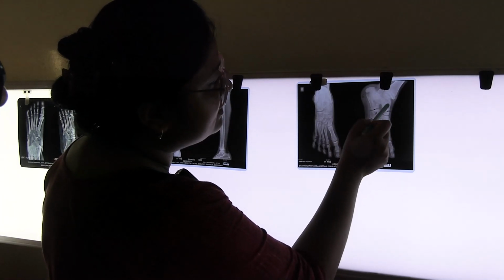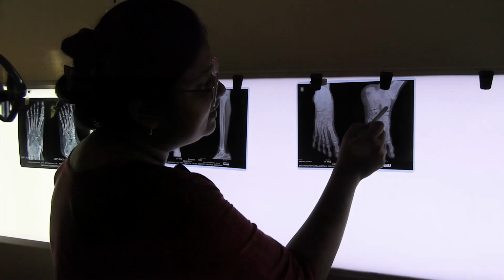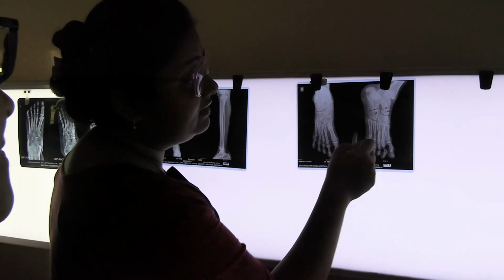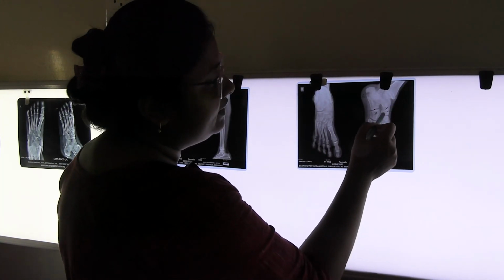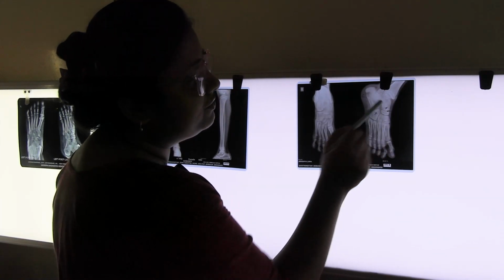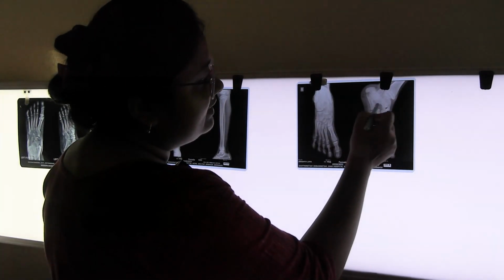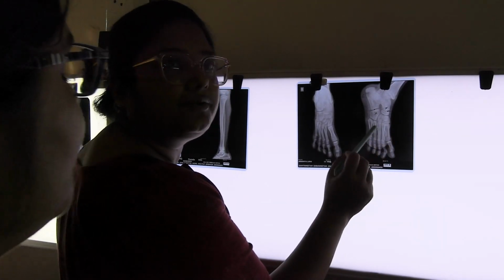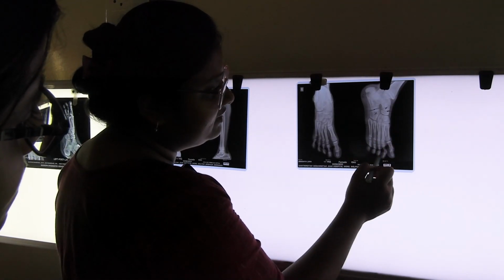Here also you can see the talus, calcaneum, lower end of tibia and fibula. So this joint, this crossmark area, this has been given in your OSPE. So this joint is the talonavicular joint, and this joint is the calcaneocuboid joint, and you must identify the bones. So talus, calcaneum, navicular, cuboid, and these are the cuneiforms. Okay, and these are the metatarsals, first, second, third, fourth, fifth, and these are the phalanges.